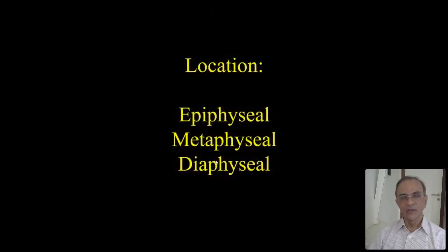Okay, so this is one second way. The first is bone density. The second is gestalt eyeball, and you can make the specific diagnosis of the point that I told you. The other way of looking at skeletal dysplasia, the common skeletal dysplasia, for God's sake, okay. Sami told me there is no time limit. Good for me. Is the location. So this is simple. I don't have to explain. Look at the location, and you can tell.